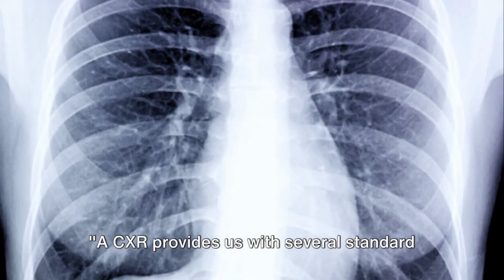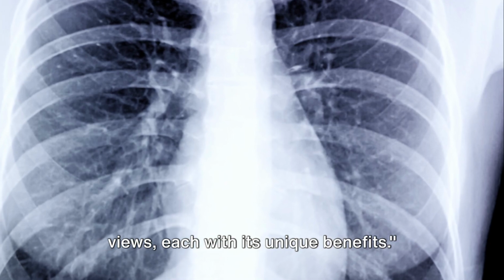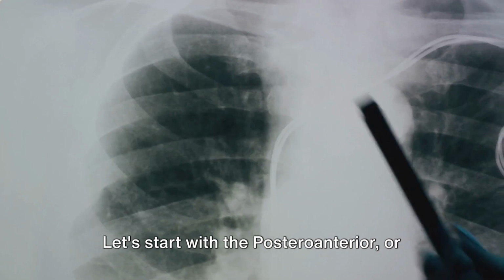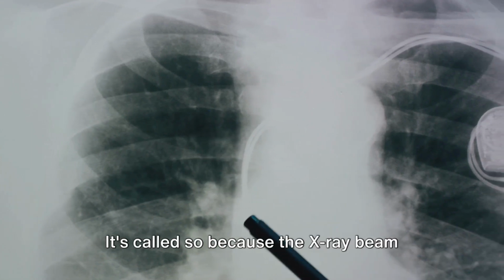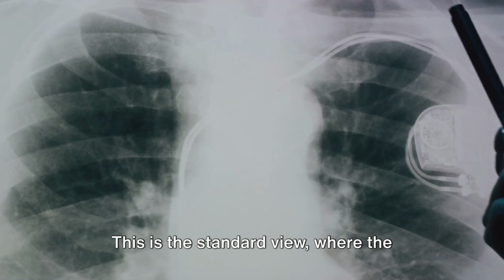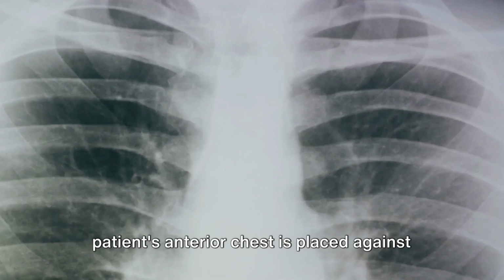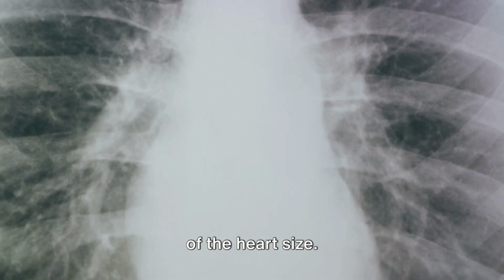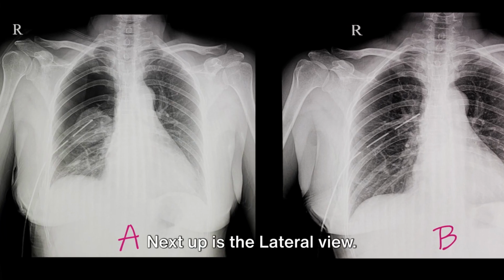A CXR provides us with several standard views, each with its unique benefits. Let's start with the posterior-anterior, or PA view. It's called so because the X-ray beam travels from the back to the front. This is the standard view where the patient's anterior chest is placed against the film plate to minimize magnification of the heart size. Next up is the lateral view.